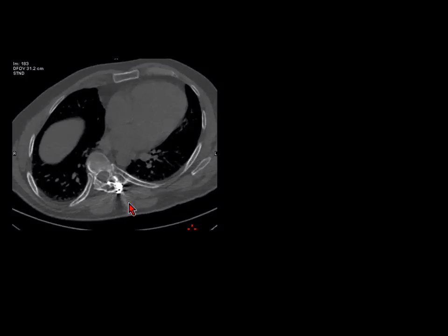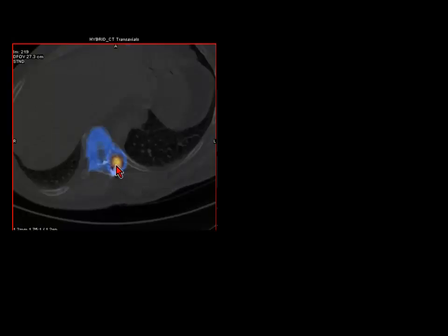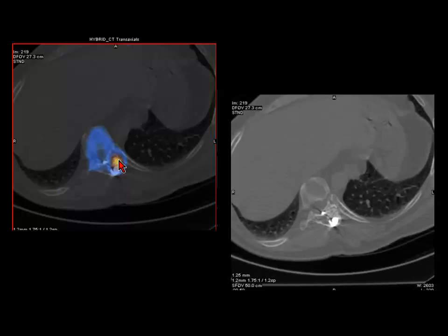It's reflecting properly. So these are the transpedicle screws going through, and on this it's very difficult to see what's happening. So if I fuse it, can you see that line? Because this is a kyphotic spine, they are overlapping and the anatomy is distorted. So that's the facetal arthropathy which has developed between the fixation. If you look at this, that's one vertebra, and the other one is basically the superior is coming here, the inferior is there, so that's the joint there. And that's the important finding.